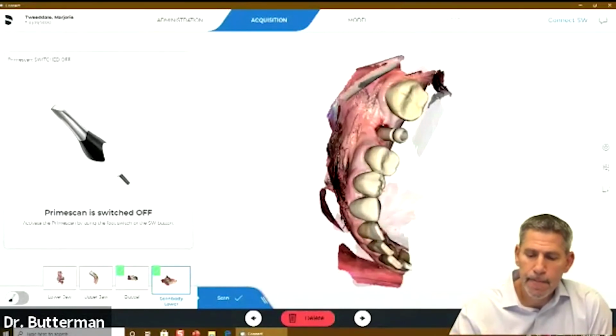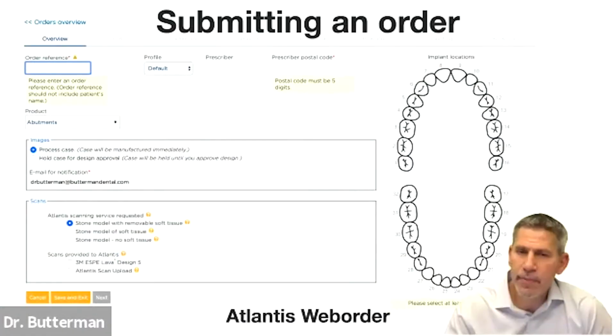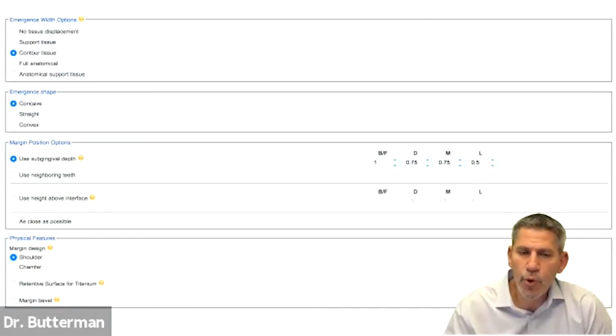When I submit the case to Atlantis, about 10 minutes after I hit submit, they're going to have it. And now they're going to allow me to put some information. I can start talking about what kind of emergence I want. Do I want to put pressure on the tissue?